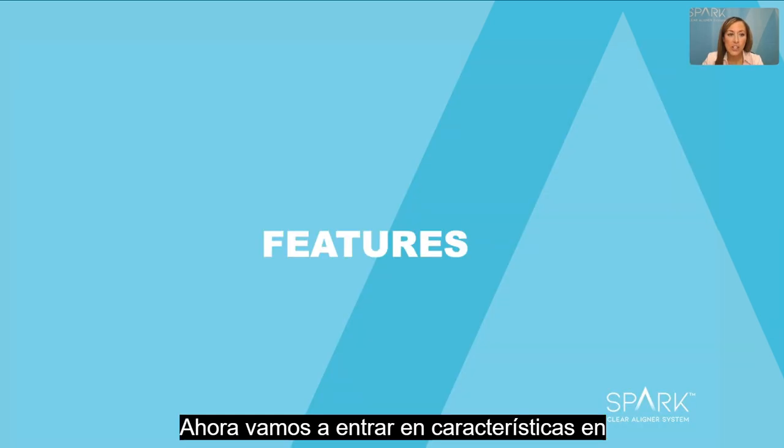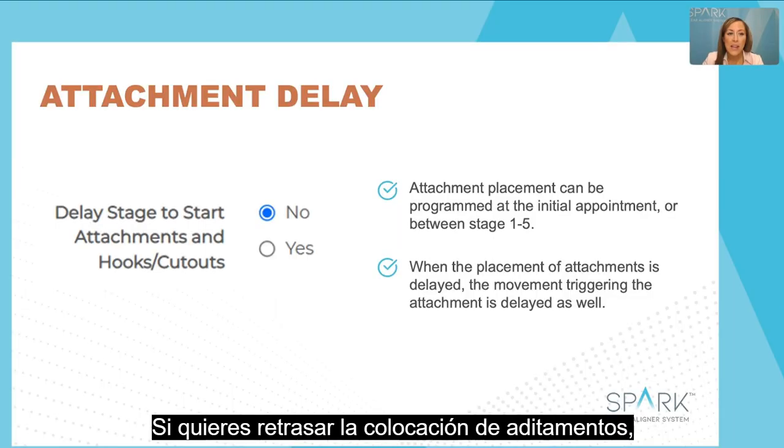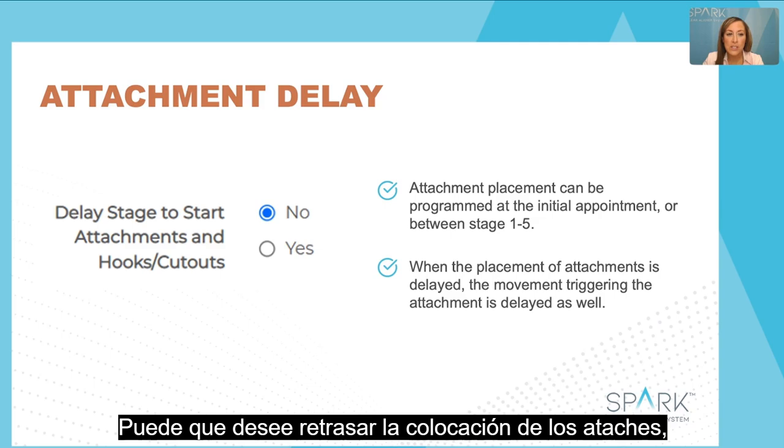Now let's get into features in the final section in clinical preferences. So if you want to delay the placement of attachments, you will delay the complex movements as well. So keep that in mind. So you will delay movements like rotations, intrusions, extrusions. These type of movements, as we know, require attachments. You may wish to delay the placement of attachments.